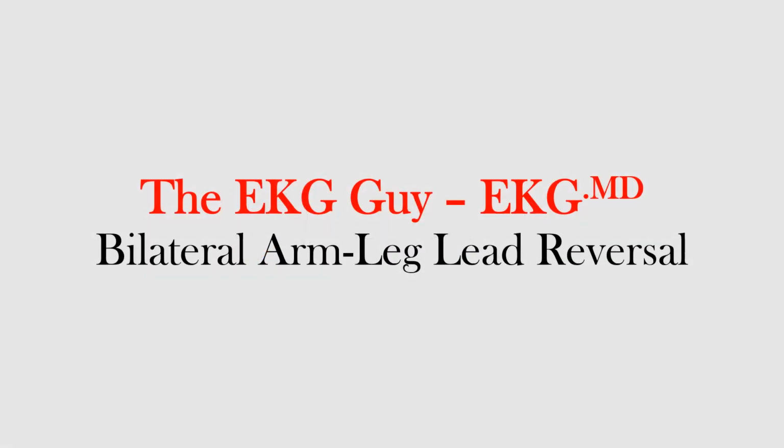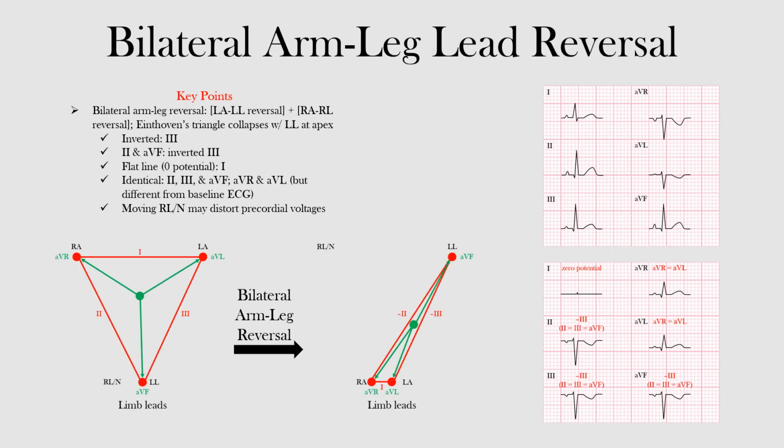In this lecture, we will discuss bilateral arm-leg lead reversal and how to identify it on the EKG. Making sure that the EKG leads are connected to the correct electrode position is important for getting accurate rhythm strips as well as 12-lead EKGs. If the leads are reversed, we call this lead reversal, and it can often produce EKG abnormalities.